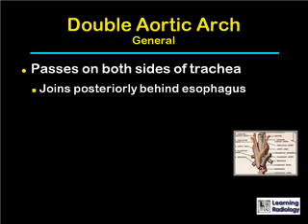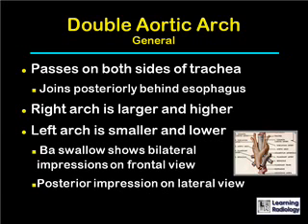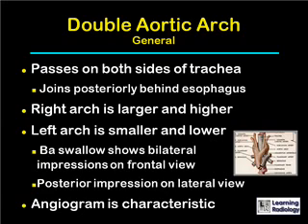The right arch is usually larger and higher than the left, which is smaller and lower. A barium swallow will show bilateral impressions on the barium-filled esophagus on the frontal view and a posterior impression on the lateral view. An angiogram is characteristic.